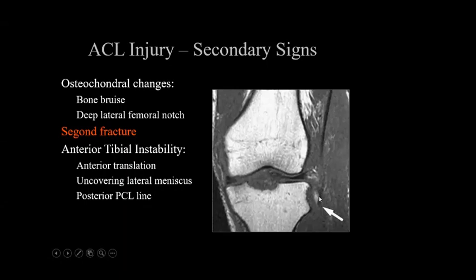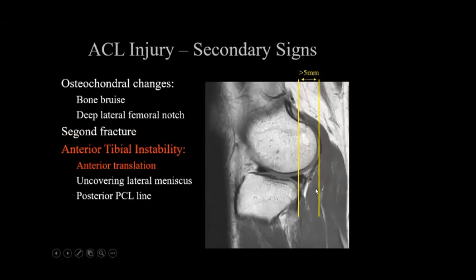The fracture itself is actually not significant. It's the association between the fracture and ACL tears that is more important. And the fracture happens because of the capsular attachment of the anterolateral ligament of the knee joint that leads to the bony avulsion injury.